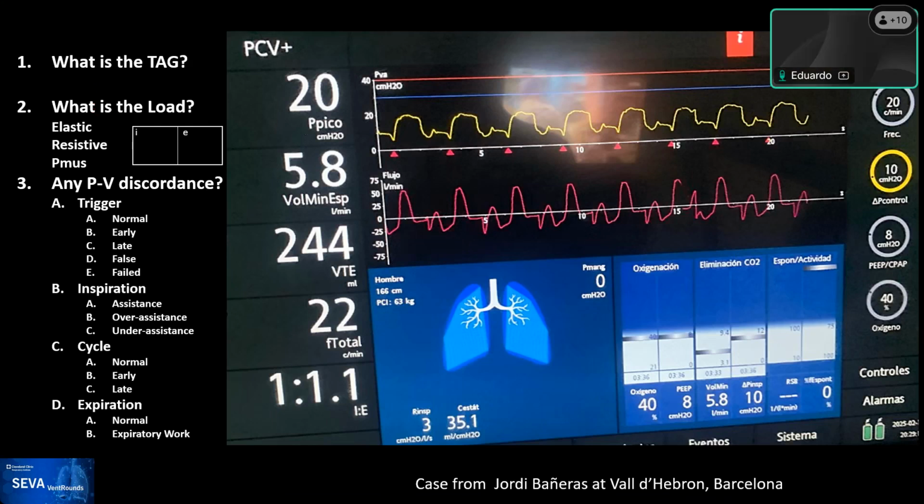Now remember, you can use your ventilator mode map. All of them are tagged there, or you may simply have memorized some of these modes. There we go. PC-CMV. Yeah, good job, Ariel. So pressure control, CMV, yes.